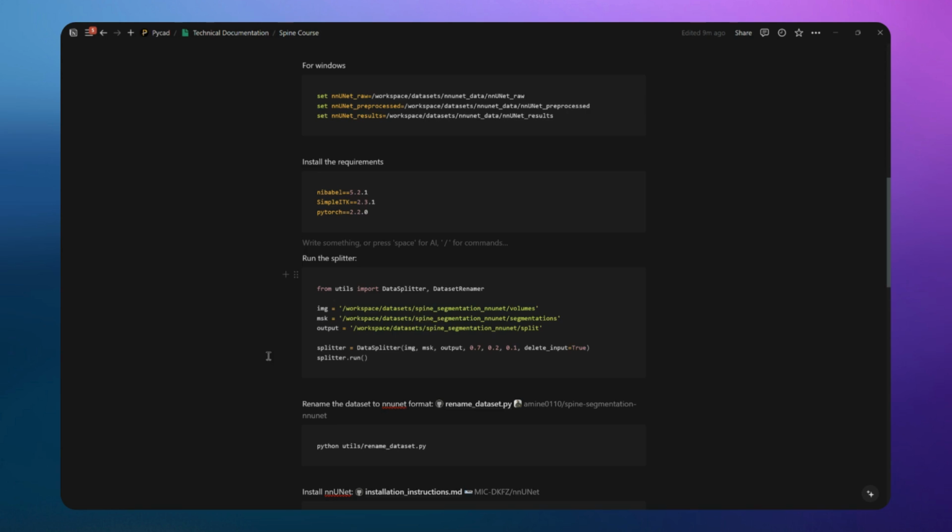So if you have just two folders, as I am doing, and the same dataset that I am sharing, then you need to split it into train and validation, or train, validation and testing if you want another dataset that will be separated just for the testing. And just to mention something, the data that we separate here will not be used for the validation, but kept just for the testing or evaluation, because the validation dataset will be taken directly from the training dataset.